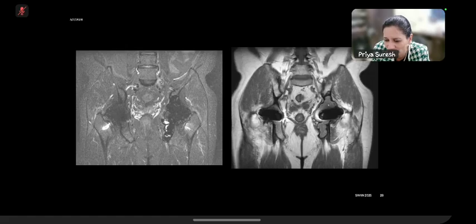So there's no new bone, there's no normal bone texture at all, the marrow has been replaced by this tissue. Okay, so you can see it sort of here, but really it's very difficult is what I would say. But T1, look very carefully at T1, and your answer will be there.